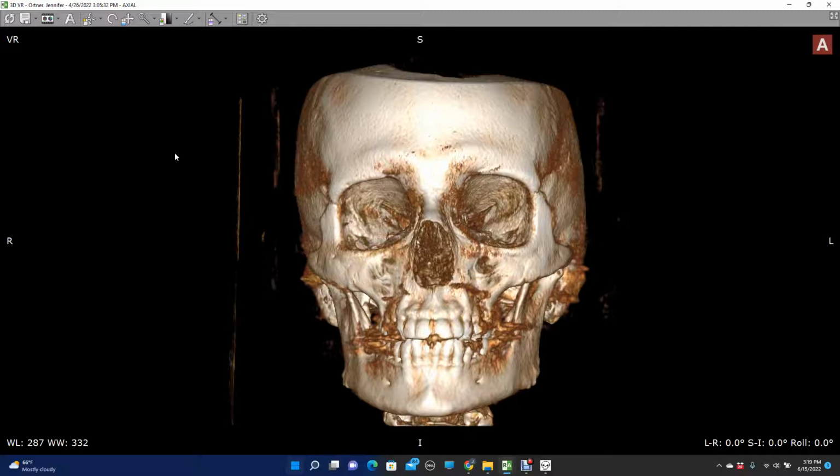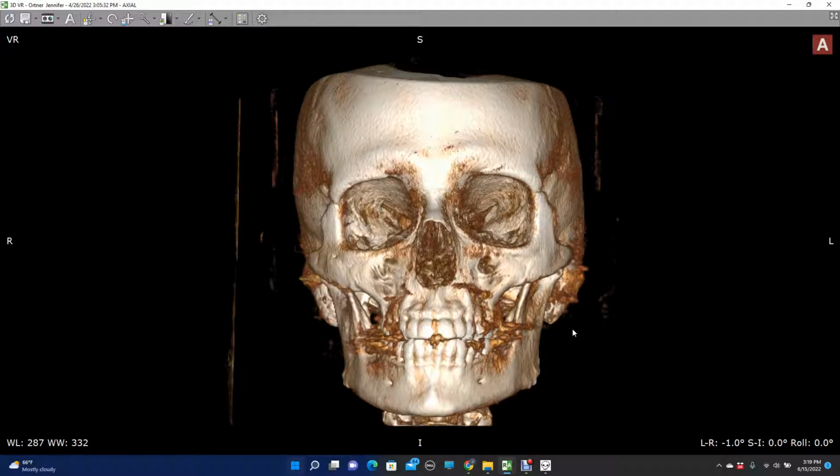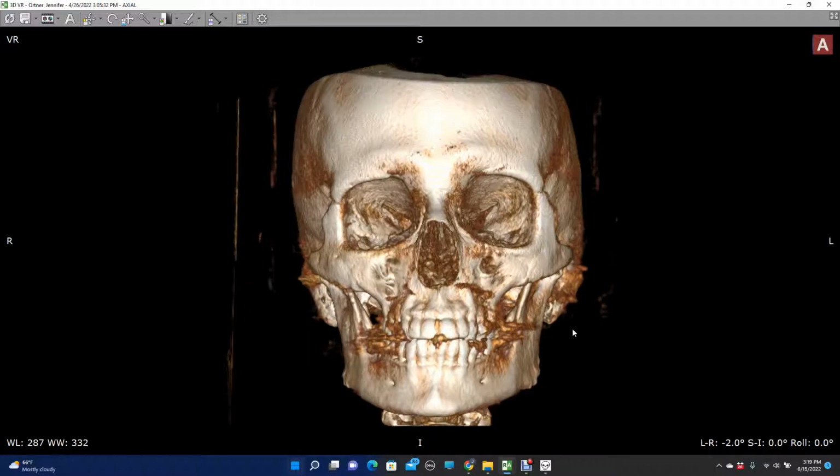And so to begin our analysis, the first thing I need to do is unrotate my image. And you can see that she's kind of looking off to the right. I can tell because there's a lot more skull showing here, there's less here. This mastoid's under the jaw and this one's sticking out. So I can use the arrow keys to start to rotate my image.